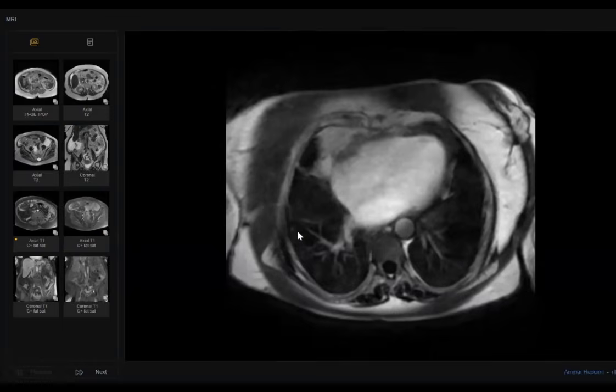And this is the scenario of the exam. You will not find the lung pathology, or the key of the case, in all the sequences, maybe in one. This case very commonly comes in long cases. Very common. Why? If you see here, the key is in one sequence only.